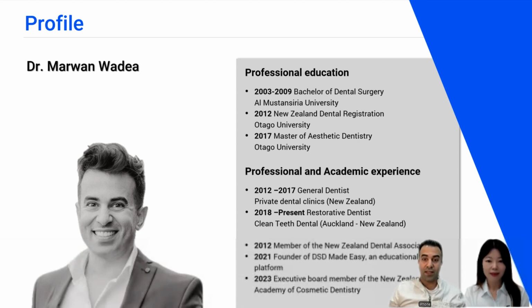I started using Mesh Mixer, which is a free software, and that's where I started applying the basic principles of cosmetic dentistry into Mesh Mixer. And that's when I learned how to use these digital tools. Later on, I came across Medit, and I started using the Medit scanner i600.